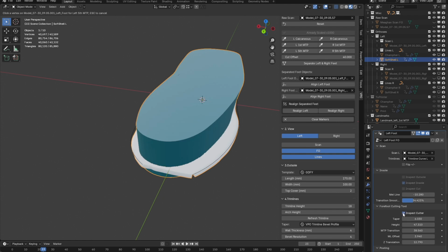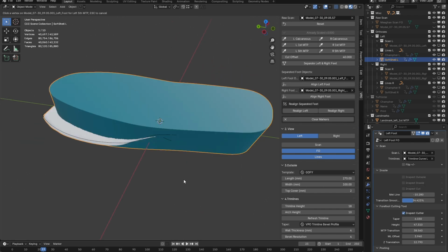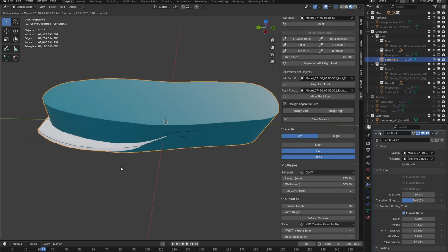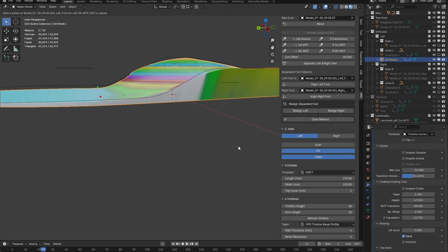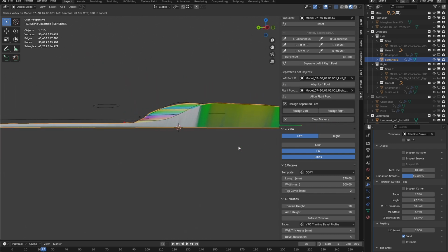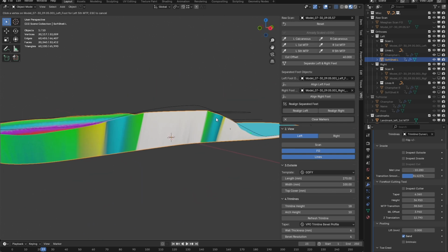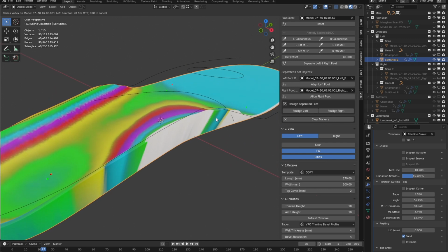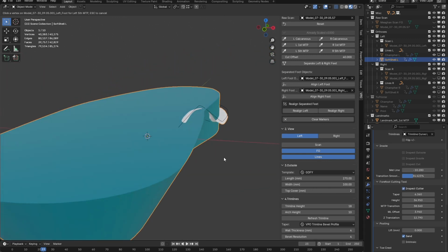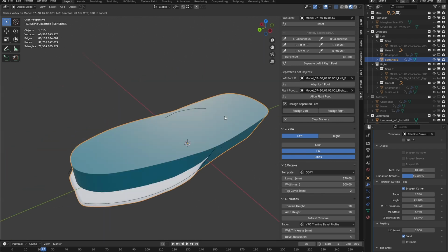Next up, the forefoot cutting tool will cut the orthotic's outsole shape along the forefoot. It does this by cutting anything that is not within its boundary. On the orthotic, you may notice white sidewalls. This is where the cutter has cut the object. Anything colorful has not been affected. If you see a strange result, and the color surrounding this result is white, check the cutter. The cutter should have the object completely contained within it, except the transition into the forefoot.